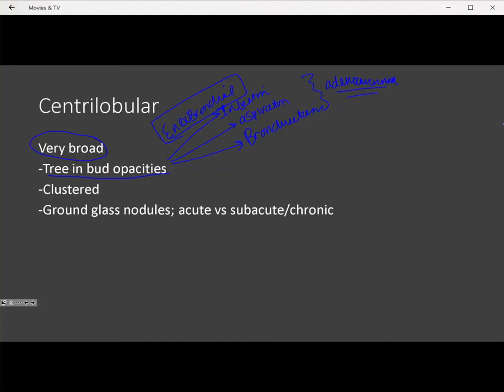That's very rare, and certainly we wouldn't think about that unless the patient has a known adenocarcinoma, and even then we'd wonder if the patient was just infected in the interval, maybe to get a short-term follow-up CT to see if those nodules had resolved. If they continue to grow in conjunction with the primary tumor, then almost certainly you're looking at endobronchial spread of disease. Lastly, there's a rare condition called follicular bronchiolitis.